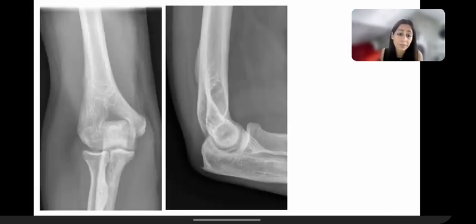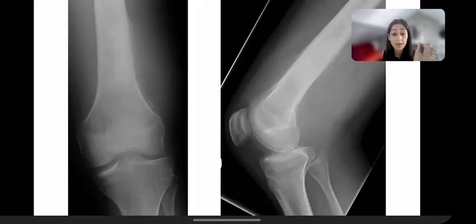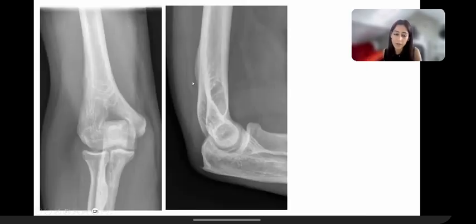Now, another patient. Just for a second, look at the periosteal reaction in this case. It's really very solid. It's like a block. It's unilamellated, very solid, versus what you see here, a really aggressive periosteal reaction. So, looking at this periosteal reaction, this is something slow growing. This is not a really aggressive pathology. Of course, there's a pathology, but it doesn't look aggressive.